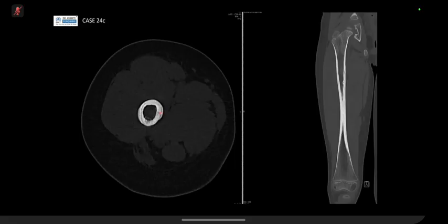And then on the CT, the same cortical thickening, and you've got this little area of lucency here. I see where you're coming from. You're thinking it's a tract, but if I say it was osteomyelitis, then you'd be expecting a bit more sclerosis and certainly some soft tissue changes, which we're not really seeing that florid on the MR. Also, thinking of osteomyelitis, yes, I did say it was periosteal in location, but often it starts in the metaphyses, then goes subperiosteal.